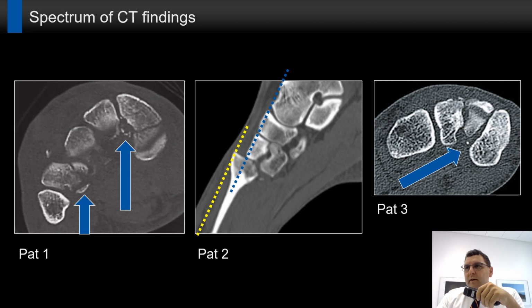And please be aware, even if you see only one single fracture fragment here in a CT, this can indicate that there is injury to the ligaments and an unstable situation. For example, here are more fragments to see. So please be aware that these little fragments give you the hint for some more and complex injuries.